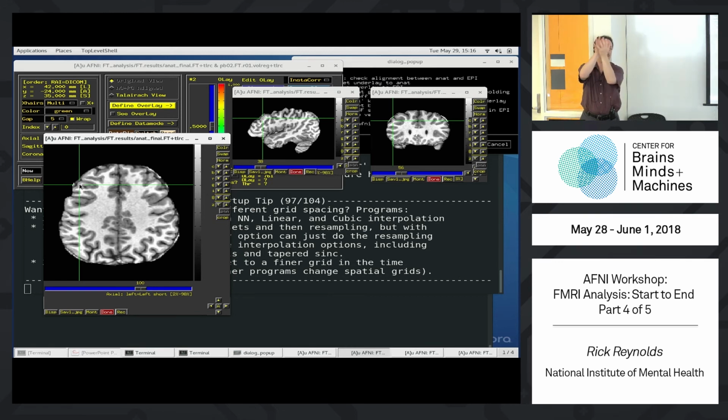It's going to plop the things on top of each other, which may look appealing at first, but not under scrutiny. This method, when it fails, can fail drastically. And at a glance, you'll see it's horrible, and you may have to help it out a little bit. But other than that, it does a much better job. But you can request mutual information if you wanted it. But in general, these LPC methods work pretty well.